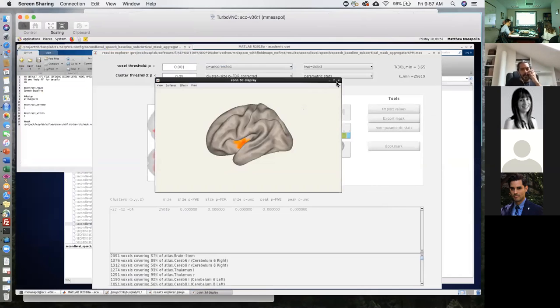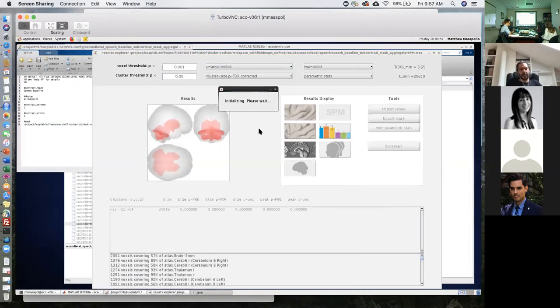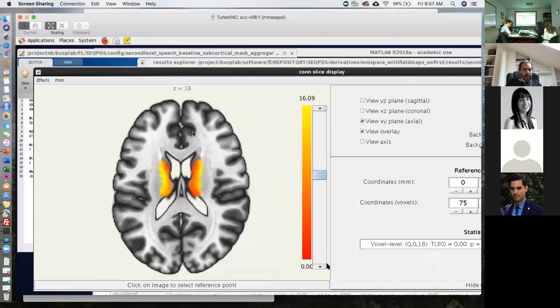The issue before was that we were seeing a discrepancy in the apparent position of the mask itself and the regions. So select the one that says effects in there, and then right at the bottom it says something about raw.